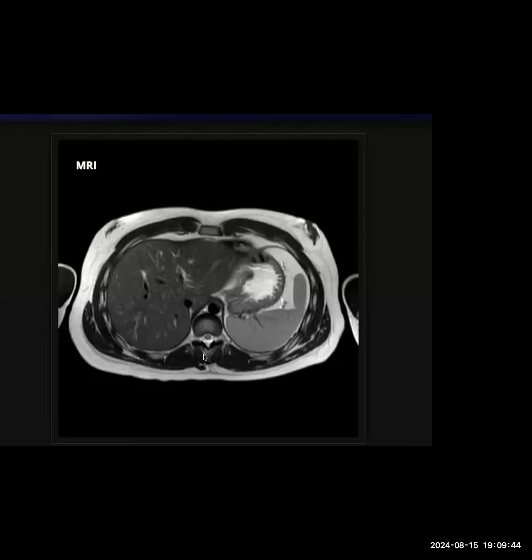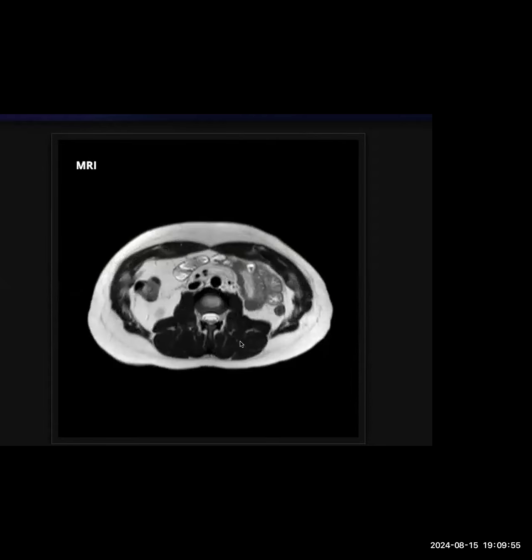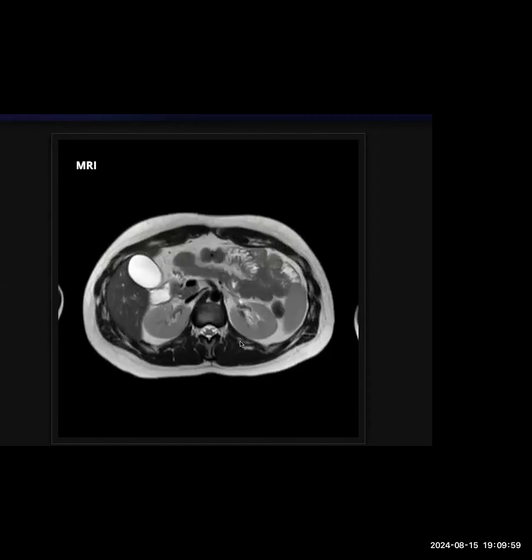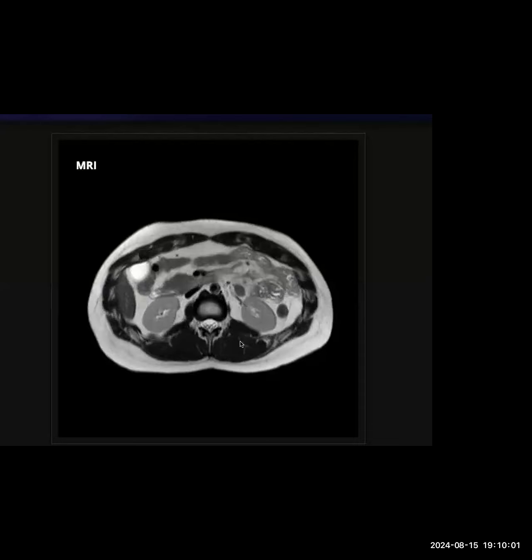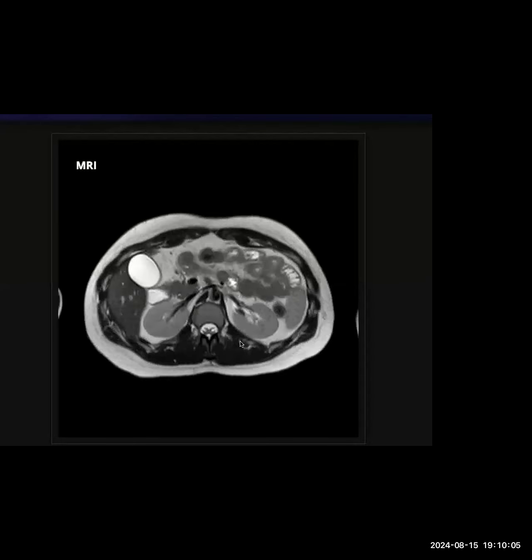Also, I would pick up that the patient could develop malrotation. Pancreatitis, yeah. I would pick up malrotation in the current imaging as well, right? Something which I can foresee in the near future if I follow up this patient, something that can come up. I can see the loop of the third segment of duodenum crossing to the left side of the pedicle.